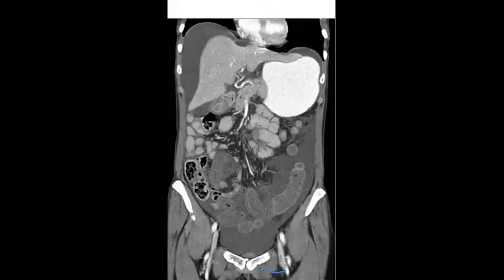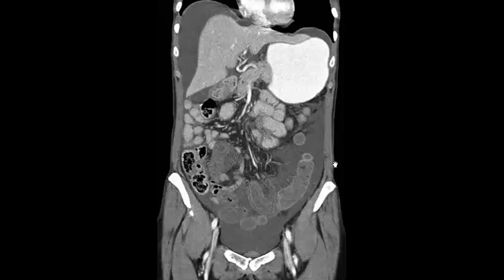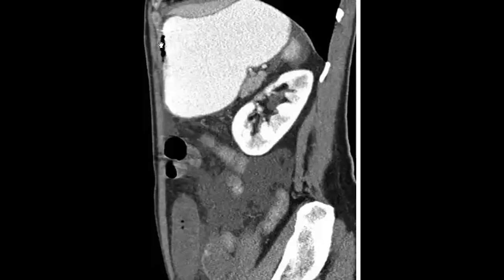And you search for the gas, and in your description, either for EDIR or FRCR, you should mention that there is no gas. So the good negative here is that you should mention no gas, okay? This is an important negative. No, it is bowel loops, gas inside bowel loops. I will show you. Either in the wall, okay? This is inside, okay? It's not in the wall. Okay.